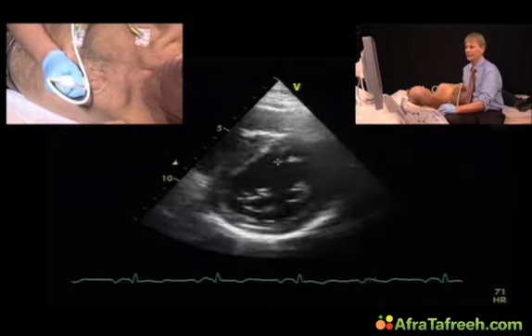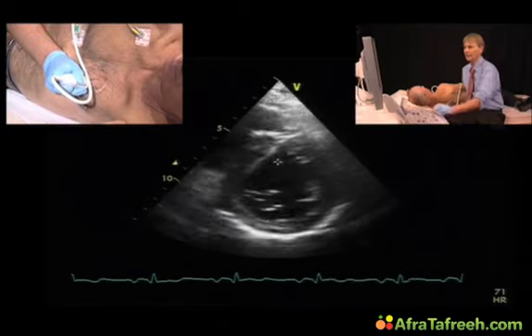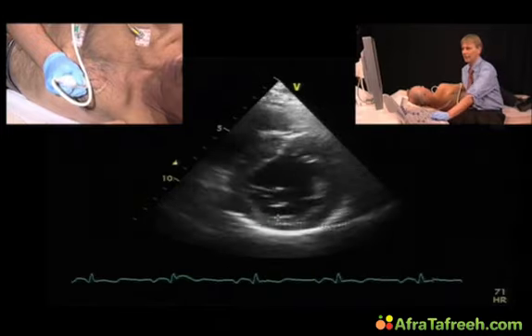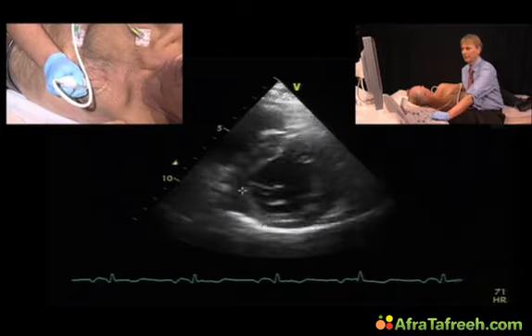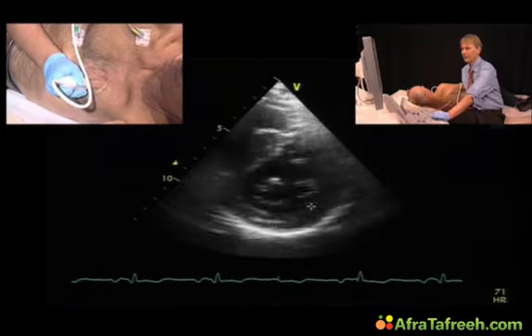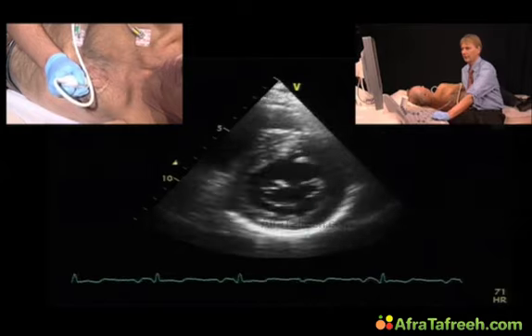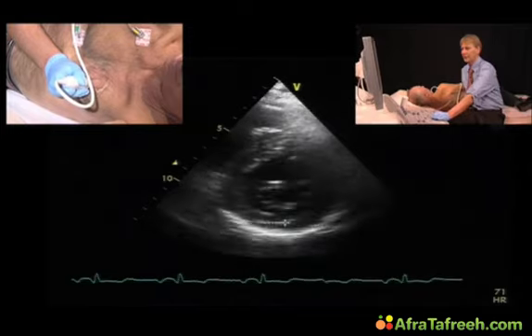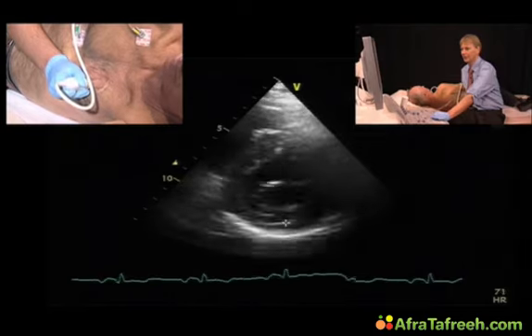And in the short axis view, again, we can correlate these wall motion abnormalities. We have a scar here in this region, inferior, posterior, basal inferior septum. So this is the region that we would find the scar. What is also interesting to see is that we have an echo-dense area within the posterior region here, which really means that there is fibrosis here.